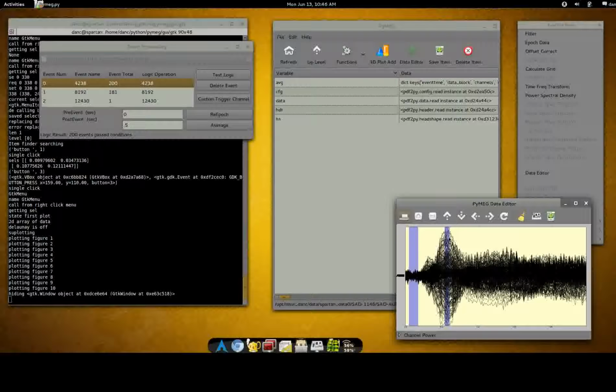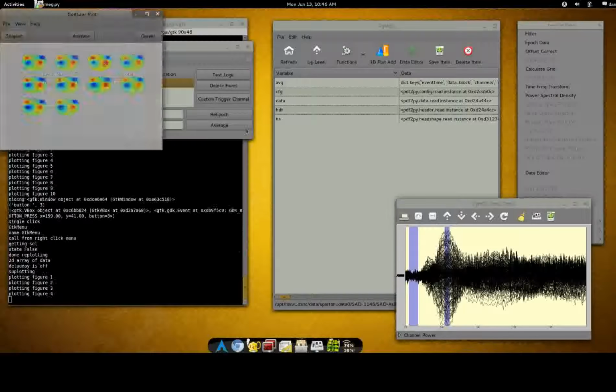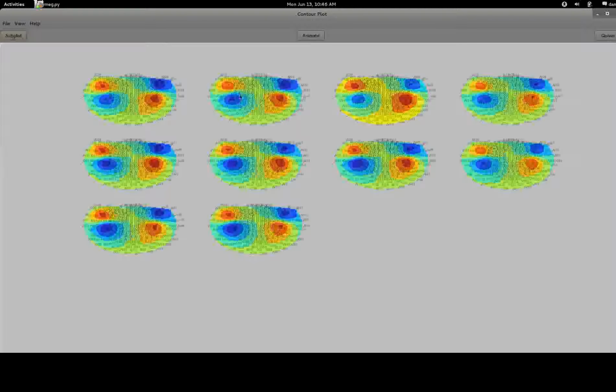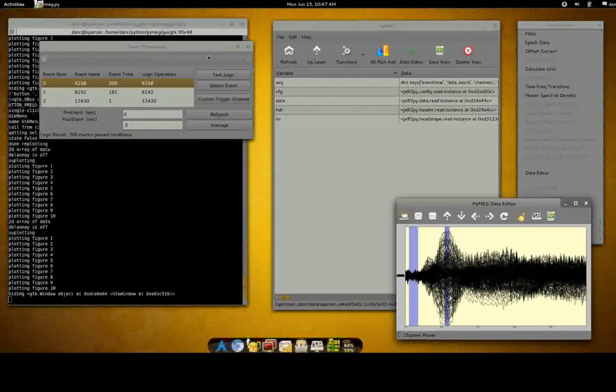So this is, let's go back to that. This is an auditory evoked response, both contralateral and ipsilateral. Let's look at the channel labels, replot, so we can find a channel that's over some of the field that has some maximal power. So for example, 174 has a lot of power underneath it.